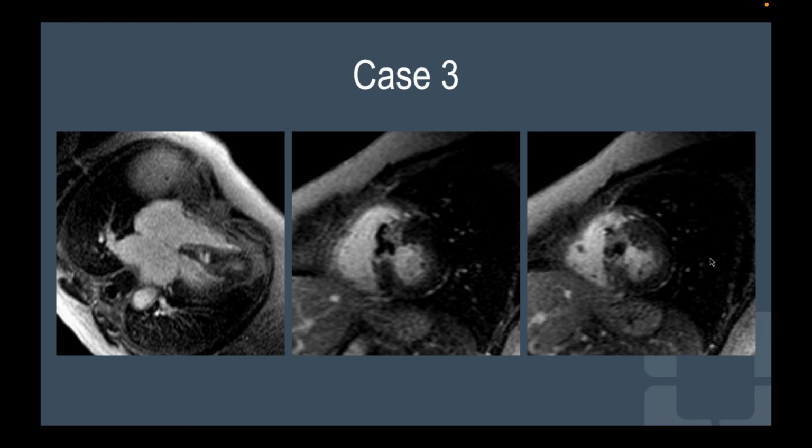So I think we're looking at a late gadolinium sequence here. And the interesting thing is that you have abnormally thick myocardium along the septum, normal thickness along the lateral wall. You have areas of enhancement in the areas where it is abnormally thick, and it doesn't have a subendocardial distribution, at least. Now the odd thing is you've got this area that is extremely low signal intensity, and it's hard to know what that is, but I'm wondering if it is some sort of calcification, which can have that appearance. It could be just that you're looking at some portion of myocardium that's not enhancing.